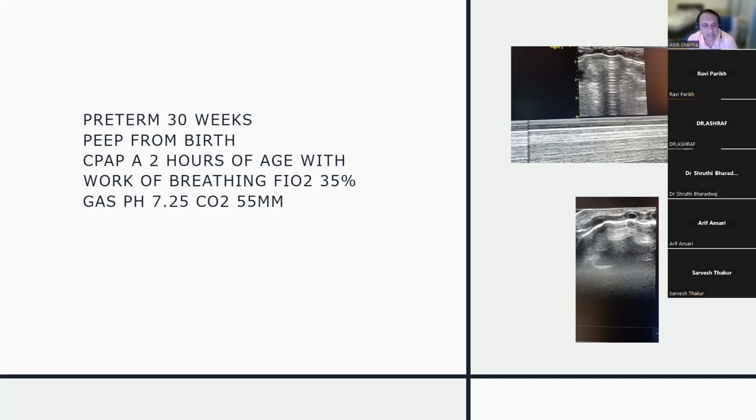Okay, so that's helpful. What do the others think? Would you give him surfactant? No, about this study ultrasound maybe with a normal, there is no need for surfactant at this time. Okay, that's great, Dr. Ashraf. What do the others think? I'm just curious. Any others? Any other viewpoints?